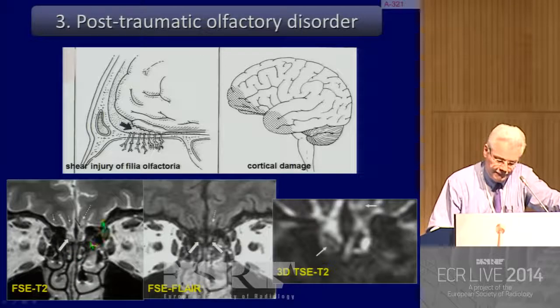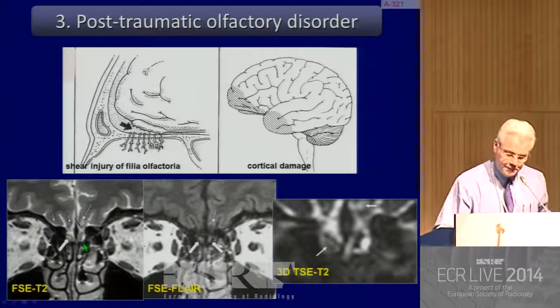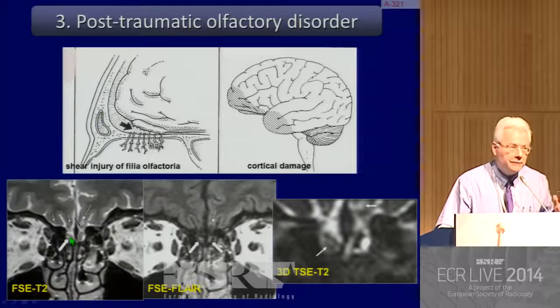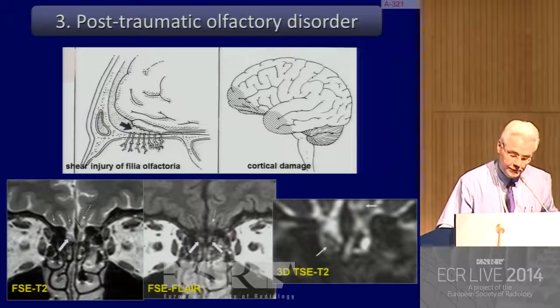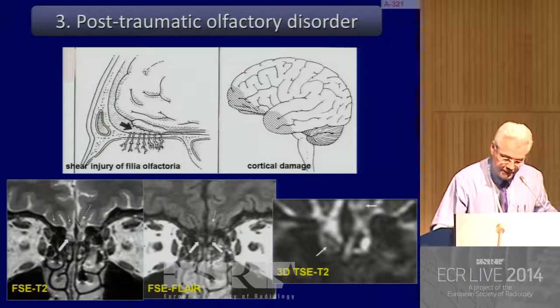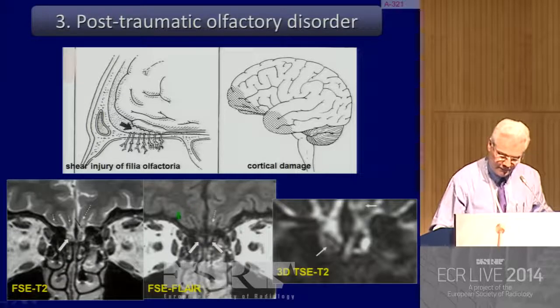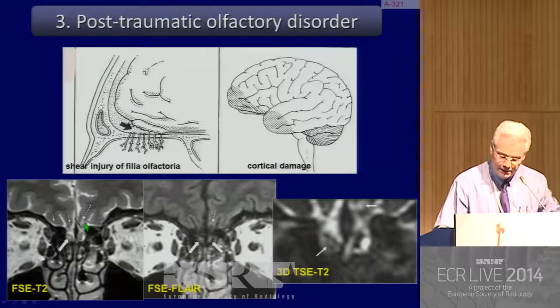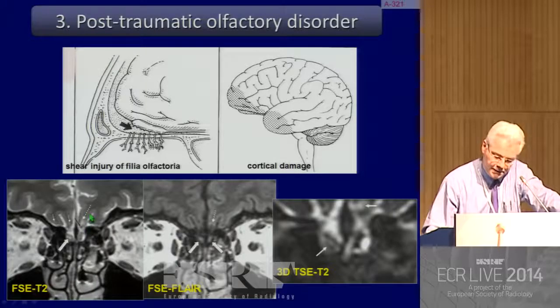Here you have a coronal T2 image in a case of post-traumatic anosmia. You will see that the right side is abnormal. You have abnormal signal intensity within the right bulb, a kind of bulbomalacia, we should say. On the left side, you have an abnormal conformation of the bulb, which is also atretic, and you have small hemosiderin deposits and gliotic scarring on the gyrus rectus here.